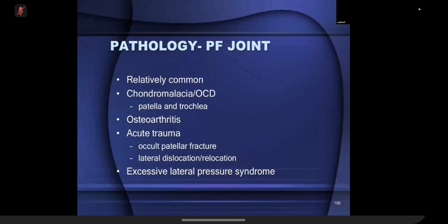Patellofemoral joint chondropathy is relatively common and historically is underreported on MR. That's actually one of the usual complaints of the knee surgeons from us. Once they put an arthroscope in, the first thing they see is the cartilage of the patella.